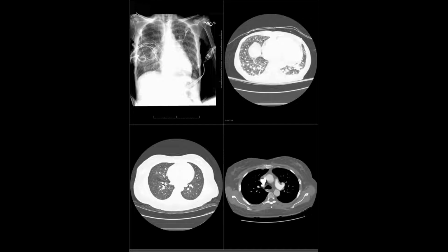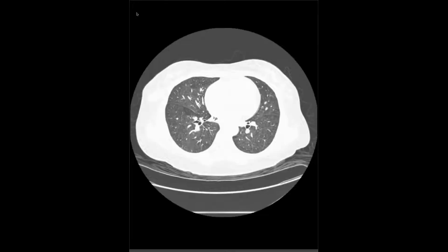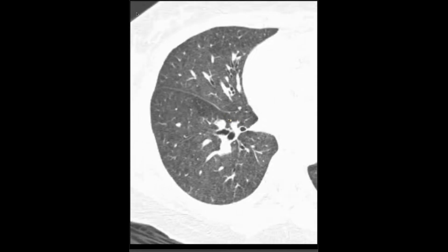I brought that up, and the pulmonologist thought it probably wasn't that. They thought it was probably just a plexiform arteriopathy, and that maybe she was in edema at the time of that CT. Do you mind going back to the first one, Brian, the original one from years ago, and scroll through, make it a bit bigger and scroll through the upper lobes in particular?